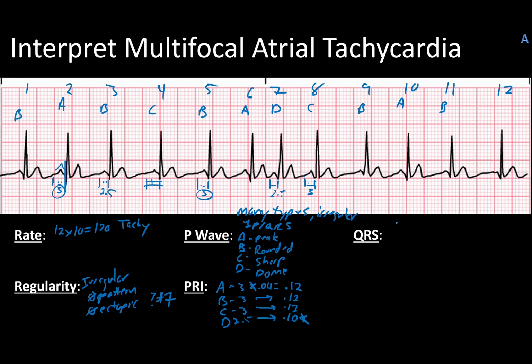They're quite uniform. The only one that's out of whack, I'm going to say, is probably number 7, because that has a wider QRS just by eyeballing it, and number 9. Those both have slightly wider QRSs compared to the rest in terms of shape. But if we go ahead and measure these out, let's just go ahead and measure number 10.